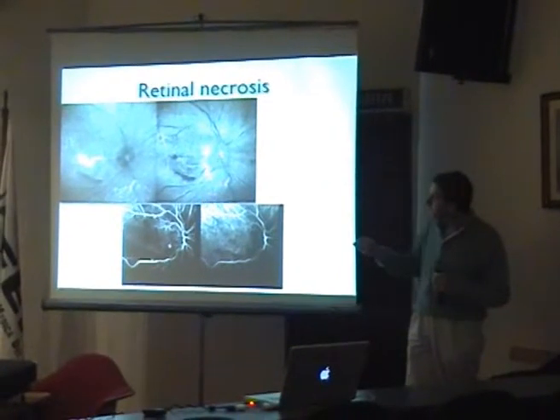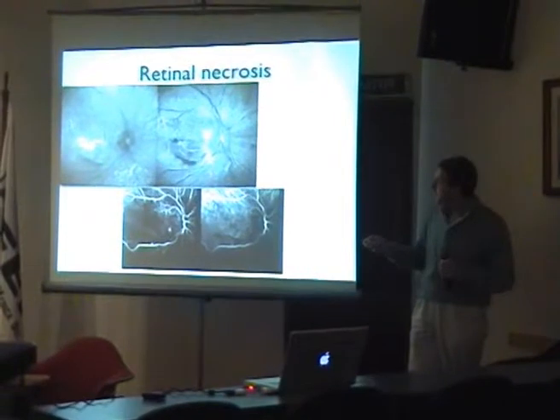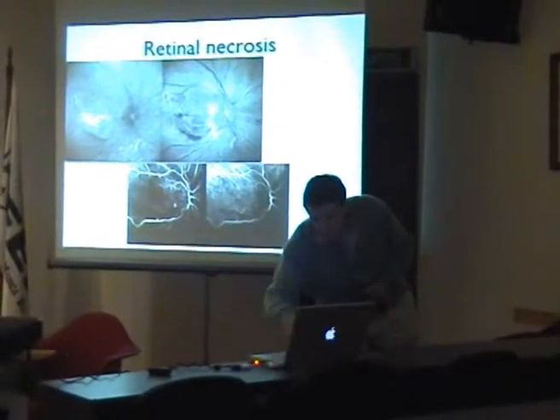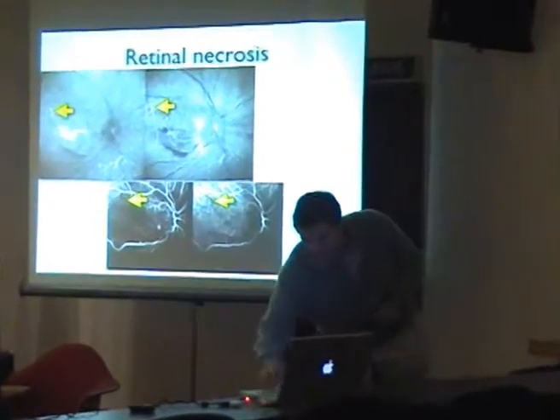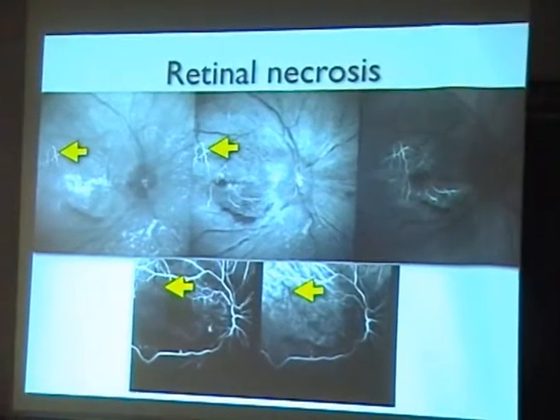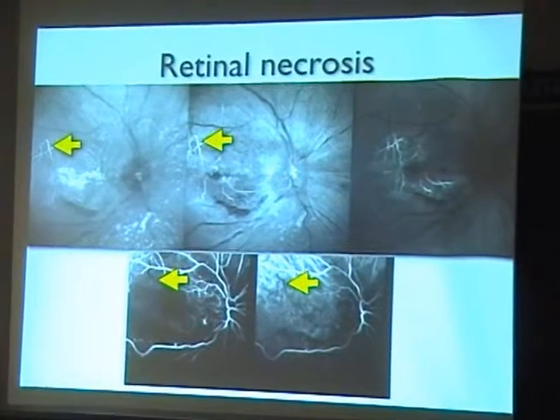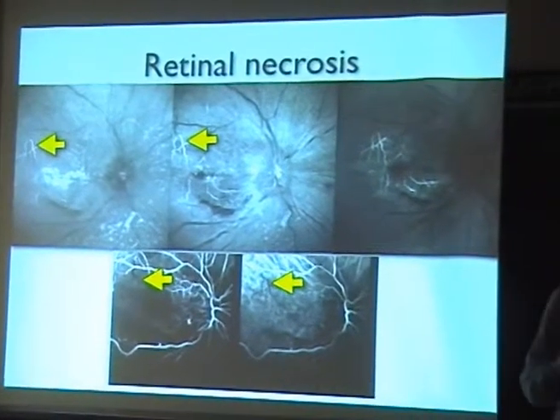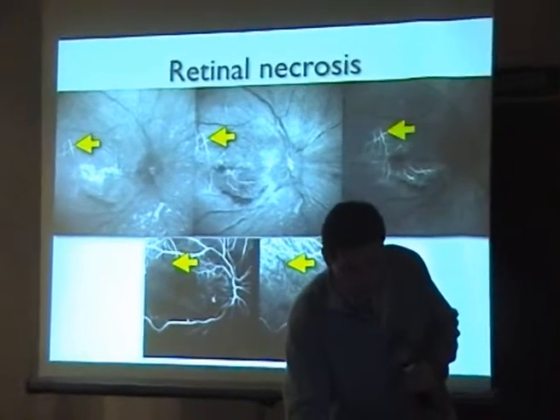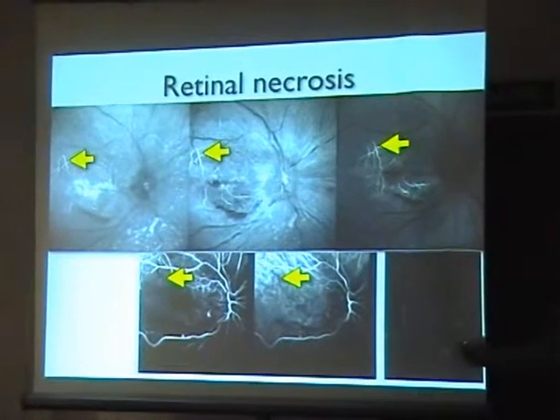And the image 2 months later, you see such things here that you see clearly in autofluorescence. You see? Now, what is that? One of the possibilities, I don't think it's correct, is that the drug that she used was fluorescent at the same wavelength.